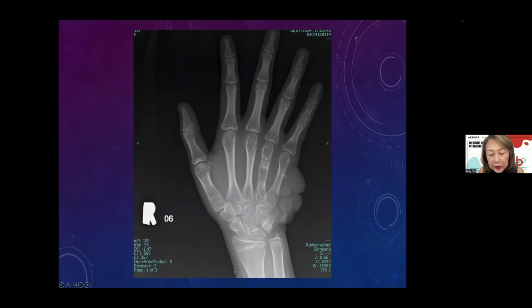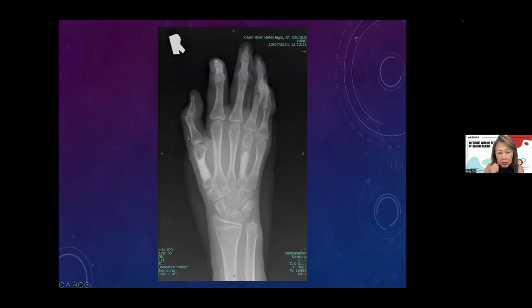So basically, the hemangioma has been there from birth, or it has grown with age. It will grow with age. So before that, it was not so big. I don't have the earlier X-ray, only this, but it can grow with age. After the operation, the orthopedic surgeon removed the hemangioma and the enchondroma and put in some bone graft. This is the post-op X-ray for this patient.